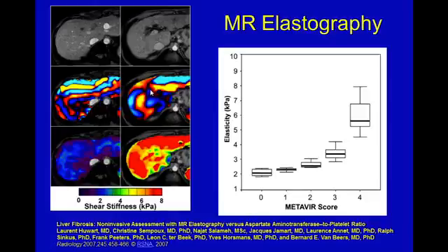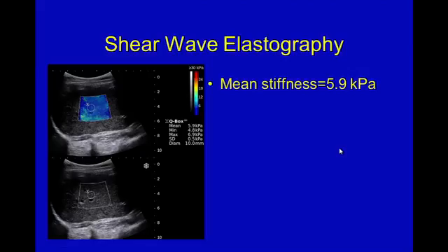And when you calculate back from this wavelength into the speed of sound, the speed of the shear waves that are produced, you actually can calculate back a relationship to the stiffness of the liver. And so here's the shear stiffness in kilopascals. This is normal down at this low range. Here with an elevated stiffness, you have the patient who's cirrhotic. And this has been plotted actually against pathology specimens, and you can see here is normal down here. And as the stiffness increases, the METAVIR score, the fibrosis score, increases as well, so that we can clearly see a difference between cirrhotics and normal, but we can also begin to tease out these areas of stiffness that we cannot see with standard ultrasound.